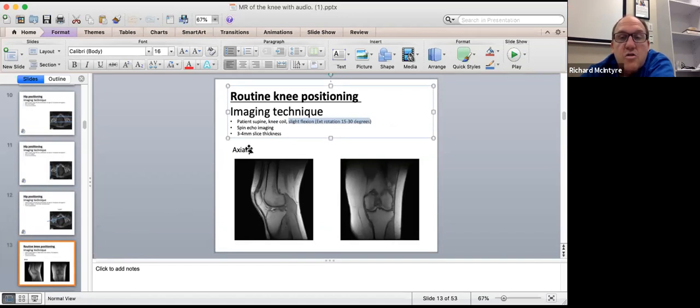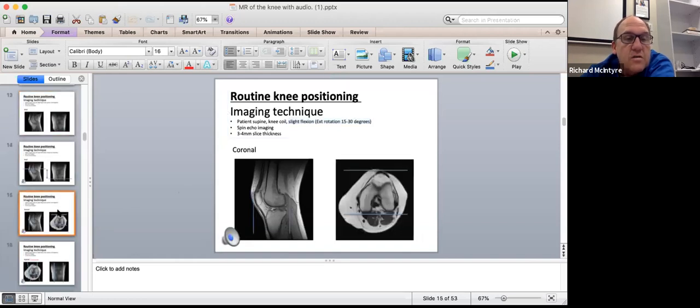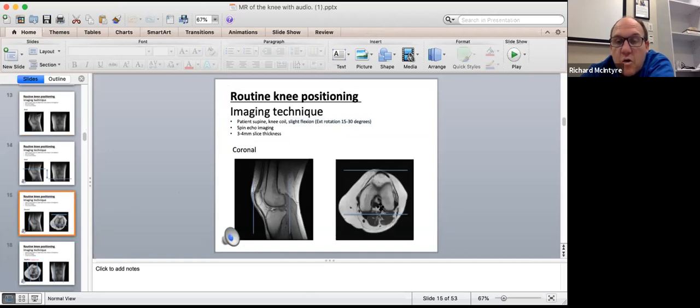As far as external rotation, in the early days of MRI, they used to have external rotation because, like the shoulder, we always angle along the ACL line. So we always like to see the length of that ACL in as minimal a number of pictures as we can.